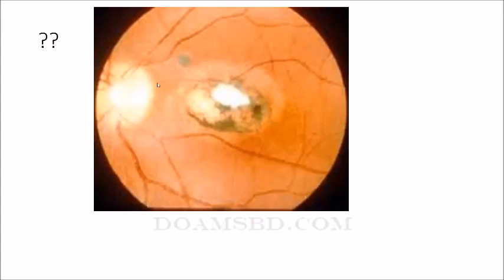Very difficult to say, doctor. The margin is visible, a distinct margin, but the optic disc is not completely white. It may be optic cupping. Dr. Mahbub, it could be optic cupping. Yes, sir. Optic cupping. So we cannot say very confidently that it is optic atrophy, but it may happen if any chorioretinitis or retinochoroiditis is there.